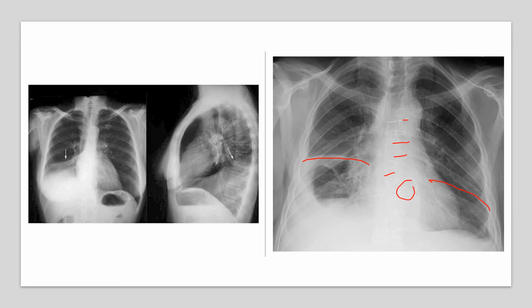So this person has a big history here, and I'm guessing they probably have a pleural effusion pushing in there, and so this is all that fluid going in the pleural space that's restricting that right lower lobe from expanding. So that's my guess, right? I'm not a radiologist or a physician, but that would be my guess here. But you can see that fissure, and it's just all that fluid collecting in that space and pushing up there on this patient as well.